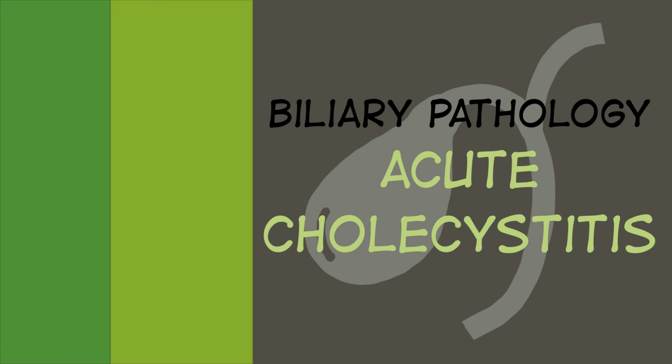So again, acute cholecystitis is such a common finding on ultrasound, and ultrasound is actually the gold standard to diagnose acute cholecystitis. So we're looking for a thickened gallbladder wall measuring more than 3 millimeters in diameter. We're looking for a positive sonographic Murphy sign. We are most likely going to see a gallstone impacted in the neck or cystic duct of the gallbladder. We will also possibly see some pericholecystic fluid and increased vascularity of the wall.